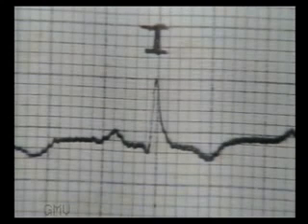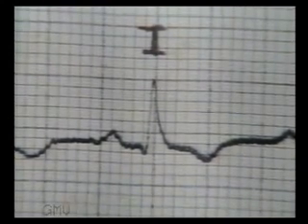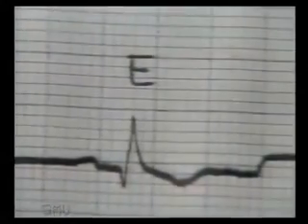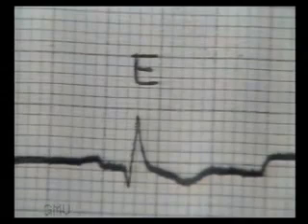Now see another tracing. No Q wave in inspiration marked I, and note the appearance of Q wave during expiration.